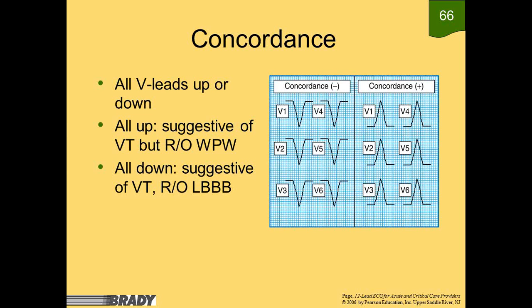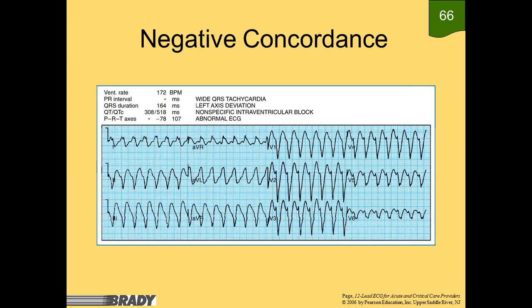look at our patient. If they're all down, then very easily could be VTach, but we need to look and make sure we don't have a left bundle branch block. So we're going to look at V1 for that. Okay. So there's our all down.